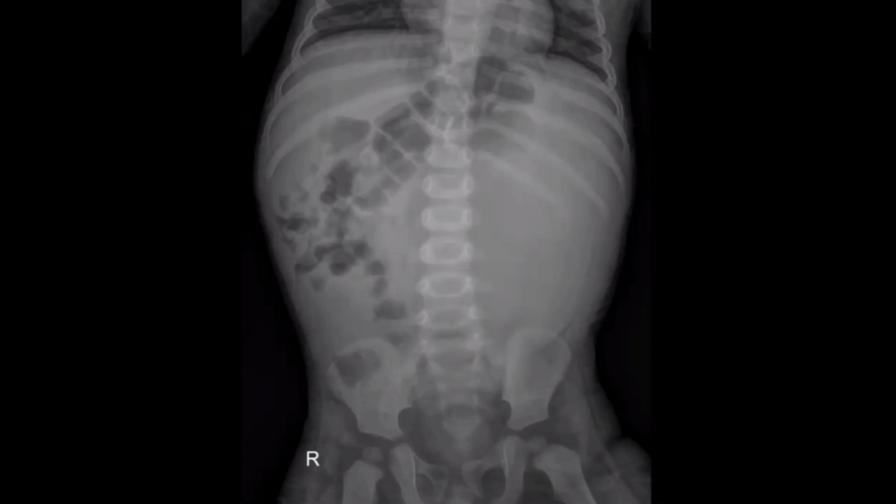I can't say for sure if there is any silhouetting of the kidney or not, to define if it is retroperitoneal, but I think it's intraperitoneal as it displaces the small bowel. A very large retroperitoneal mass will also displace it. So I would go for abdomen and pelvis CT with contrast enhancement.